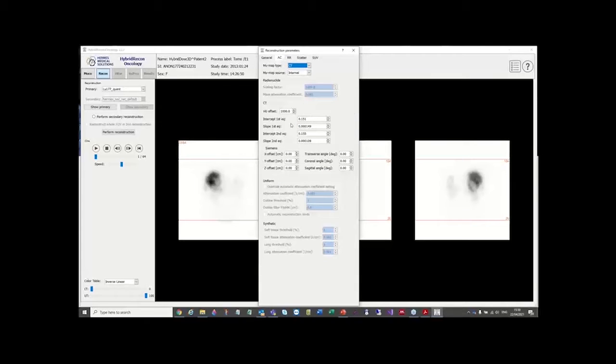We're doing attenuation correction based on a CT. We can use an internal or an external, just meaning a CT that was acquired simultaneously with the SPECT, or a CT that's brought from PACS externally. And then there are steps where you can align that with the SPECT before doing the full reconstruction. So really nice flexibility there, meaning you can still use a CT to get this really good quantitation without having to have a SPECT/CT scanner, which is a nice option.